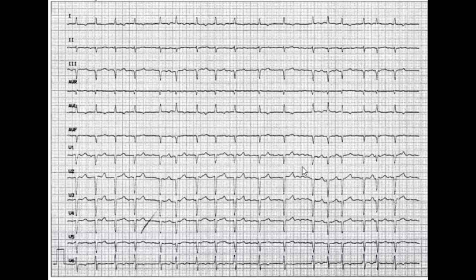You say atrial fibrillation immediately. Sometimes that's the only way in internal medicine that we figure out that something is atrial fibrillation. We look at the action, we see it's irregular, we say it's atrial fibrillation. So PQ should not be calculated when you see atrial fibrillation or atrial flutter. QRS complexes are narrow. Here, I think they're like 0.10.